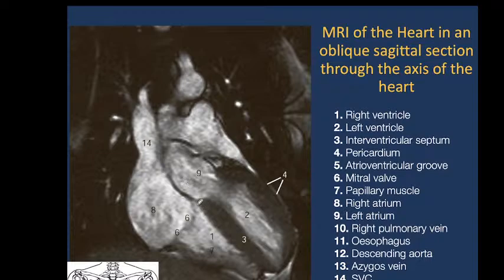And you can also nicely see the interventricular septum here.